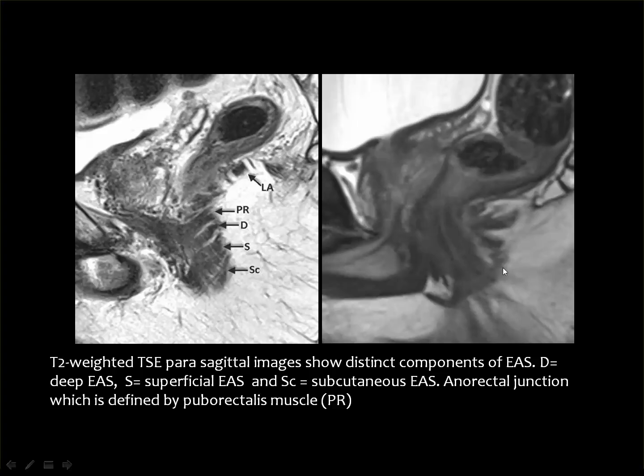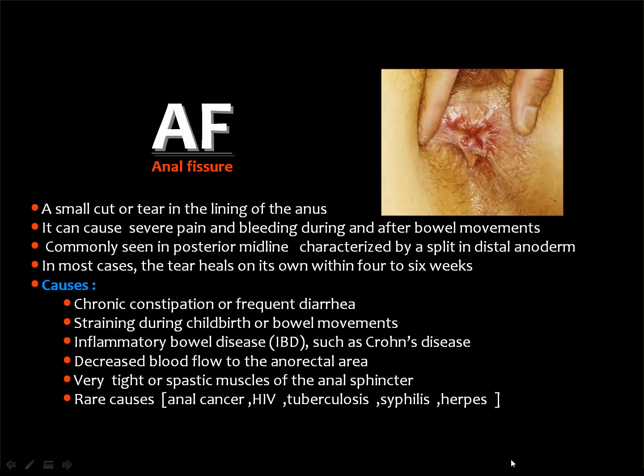You may feel that you have some difficulties looking at the sagittal image, but after a while you will see it's very beneficial in evaluation of different pathology in this particular area. Then if you look at this muscle going away from the rectal wall, this is the levator ani, and here you can see the site of the levator ani.